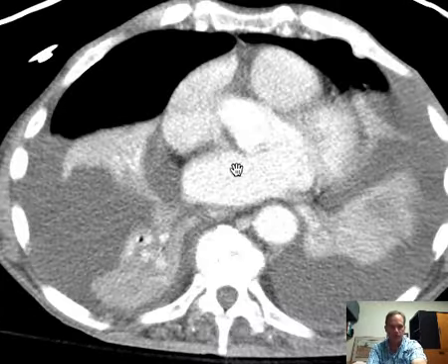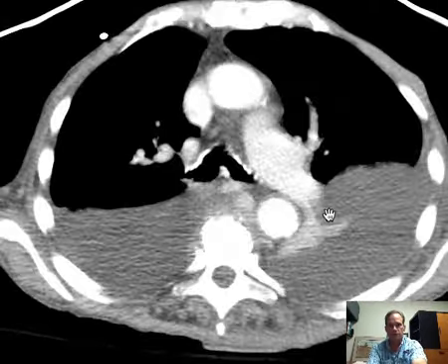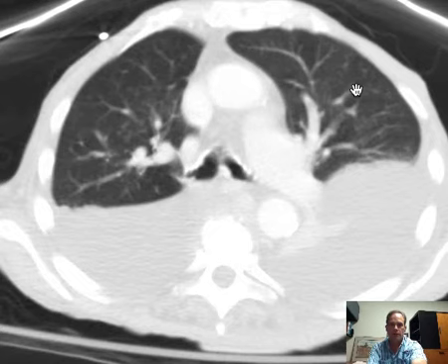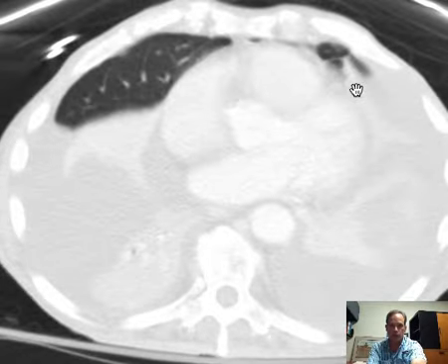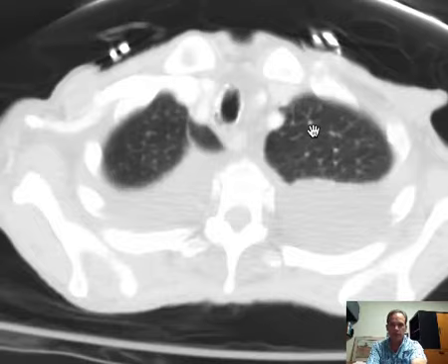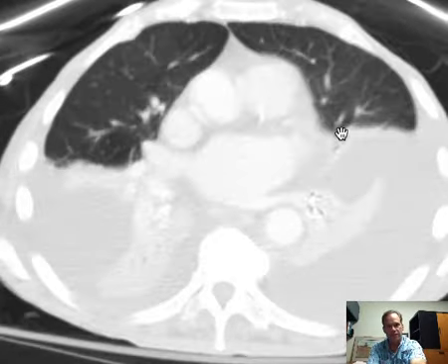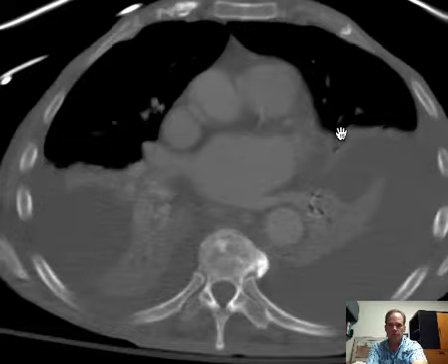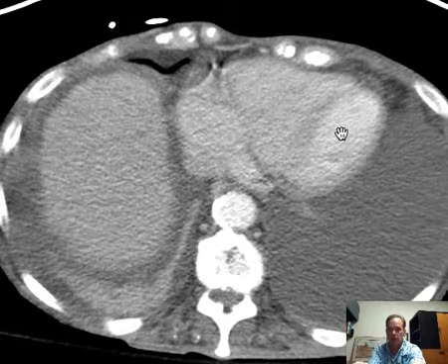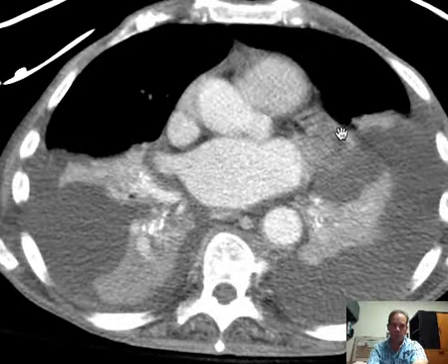So look at the pleural fluid and see what it's doing to the lungs. Look at the lungs. Now here you have aerated lung. And you can see changing the windows to lung windows, and that's what these are called, lung windows, demonstrate the vascular branching within the upper lobes, which seem less affected by this pleural fluid. But other parts of the lung look abnormal. How would you characterize that abnormality?